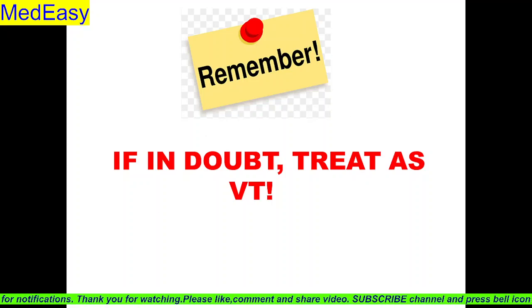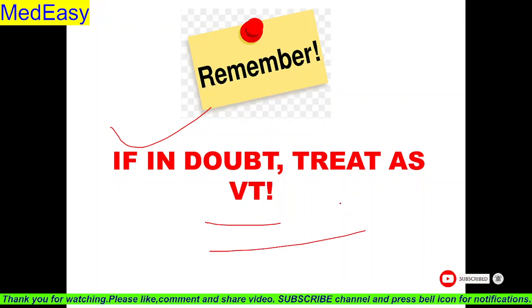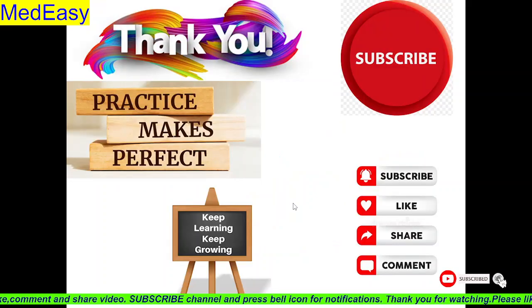But remember, whenever you are in doubt, if in doubt, treat as VT. So if any rhythm is a wide complex tachycardia, and if there is a doubt, it is better to treat that rhythm as a ventricular tachycardia.